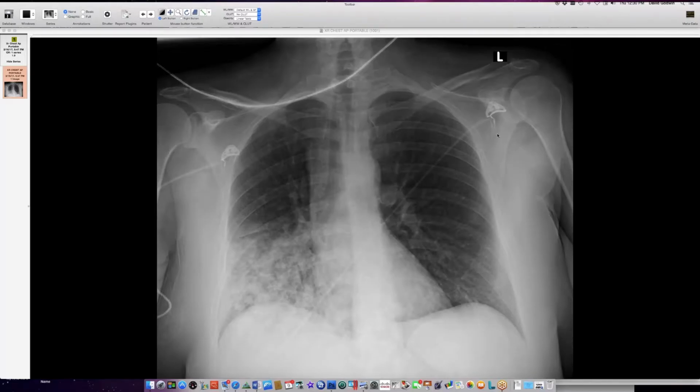So can people see a chest röntgenogram here with right lower lobe consolidation? I can. Okay, so this person came in with shortness of breath and coughing up, choking on mucus plugs. She described coughing up things that reminded her of the Harry Potter scene where his friend Ron is coughing up slugs because he accidentally hexed himself with his wand. So this person described that sort of thing and had this chest radiograph.